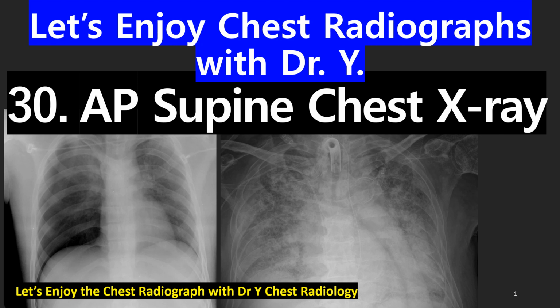Session 30, AP Supine Chest X-ray. Today I'll explain the difference between PA erect film and AP supine films, and will show you several real cases of AP supine radiographs.